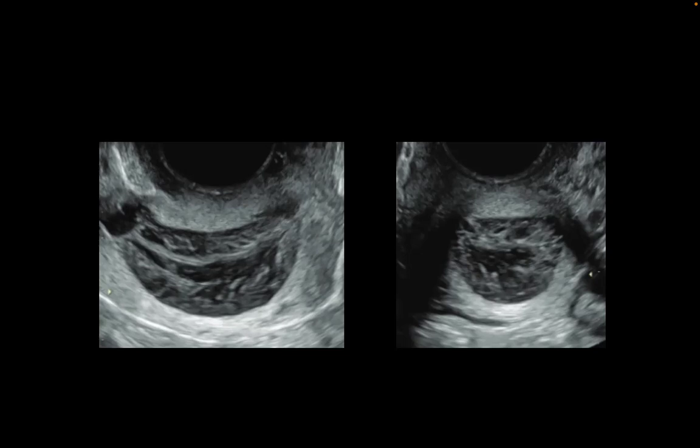They also did an MRI to assess this lesion, which again did not show any contrast enhancement of this part. And these are nothing but plicae palmatae. As I told you, the endocervical mucosa, which is lined by a single layer of columnar epithelial cells, can often have longitudinal ridges, which can be unusually prominent, as you see here. They can be as prominent as these, and these are nothing but the normal endocervical ridges or the plicae palmatae, which are totally innocuous and nothing needs to be done about them.